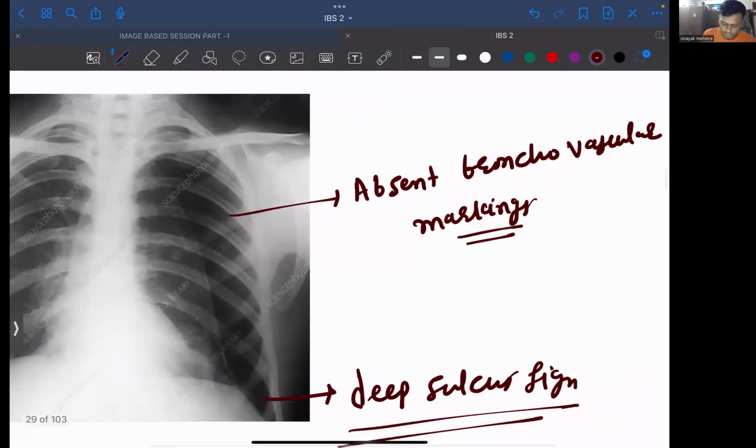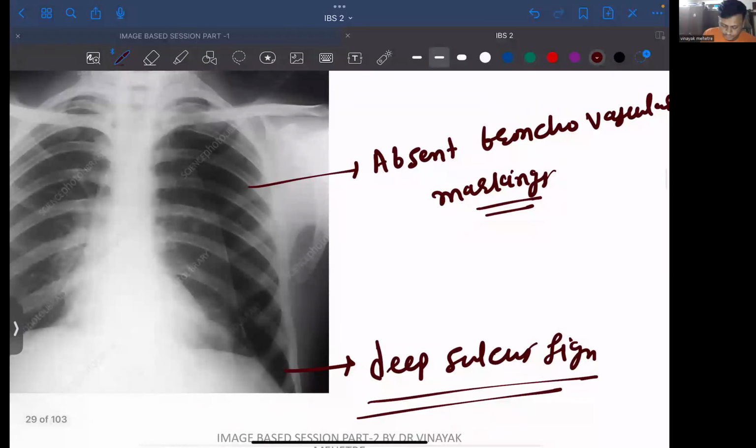Again, viscera and pleura. Visceral pleural reflection. ये जो लाइन दिख रही है, straight line आ रही है between viscera, that is organs, है ना, visceral organs होते, viscera and pleural cavity. ये लाइन क्या कर रही है? दोनों को define कर दिया clearly.